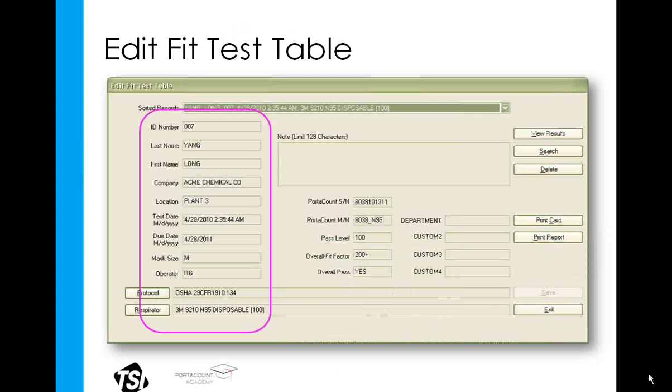We're going to take this screen section by section, and I'm going to review the available features rather than kind of stepping you through each one. Here we see the people, respirator, and protocol used during the fit test. Those of you familiar with the fit testing process will recognize these as the first 3 steps before beginning a fit test.